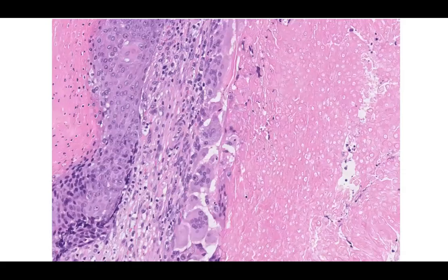Case 3. Take a look at this picture. And what stands out to you, think about the patterns that you were seeing. And this is a still image that should be diagnostic for a particular type of lesion that you're going to see a lot in dermatopathology.